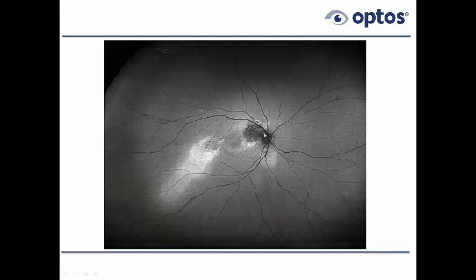Well, there's a zone here supratemporal to the disc, which is very, very dark. Again, that would be dead retinal pigment epithelial cells corresponding with dead or dysfunctional photoreceptors. Around it, you have some bright zones. Okay, so these are sick cells. Over here, we have what we sometimes call a descending tract, and this is due to fluid at some point leaking, and it goes inferiorly because of gravity.